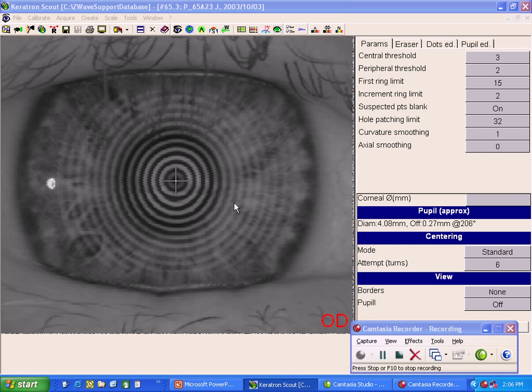When we look at this with our naked eye, we can see several things ourselves, just using our own brains to analyze this reflection. This is a reflection of Placido's ring disc off of the cornea, and we can see that these are some eyelashes up at the top, and we can see this little white streak up here, and we know that that's a tear meniscus up there. That's not a reflection of anything, that's the tear meniscus. And we can see that down below also. So we can see a meniscus of tears along the border of this eyelid. We also see this little bright spot over to the side. That's probably the little light on the equipment that reflects off of that. We can see several things.